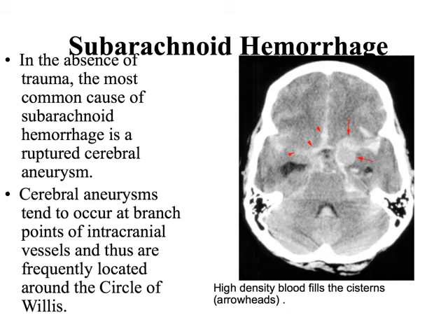This is going to tend to occur at a branch point of intracranial vessels, which follows with what we know about how blood clots work. They come to a branch, and the stuff narrows, it'll go to the wider side and clot off, and then all of a sudden you have bleeding, and pressure has gone to peripheral vessels, and now we've got bleeding throughout. So this ruptured, and now it's bleeding into this area here.